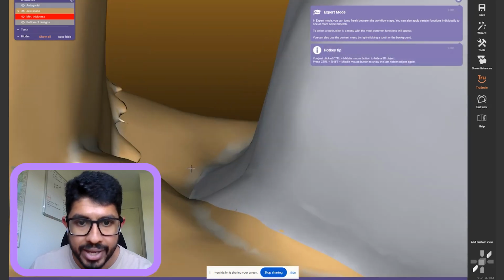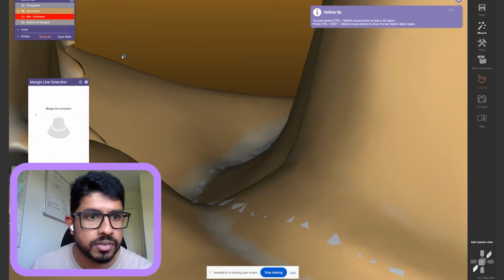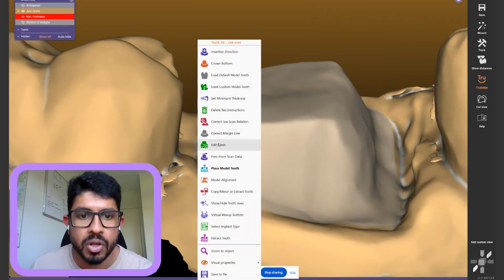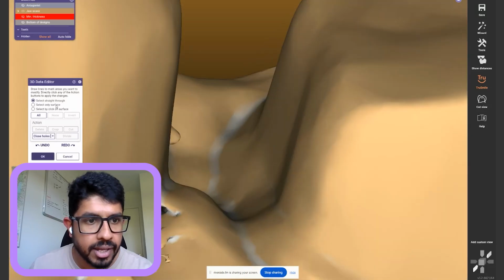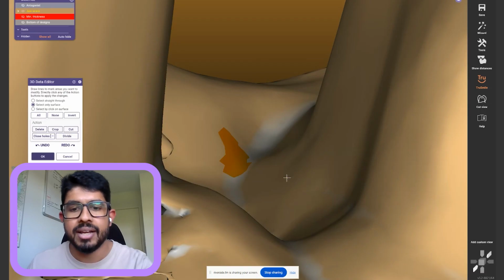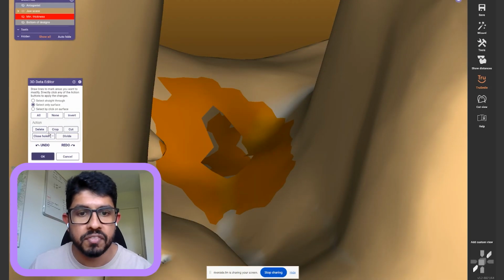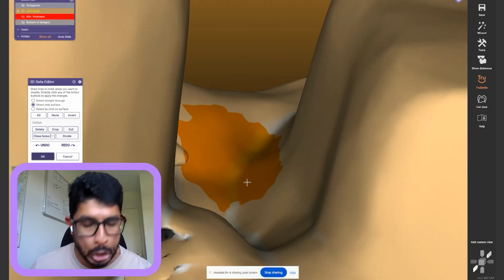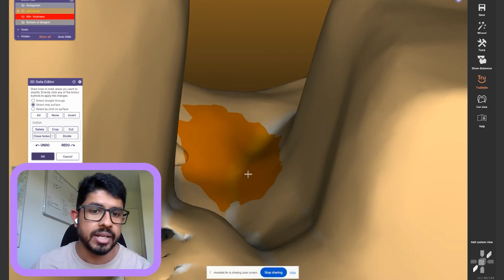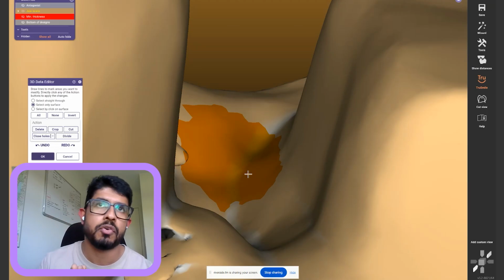You can actually go ahead. Let's say you had a little tissue tag over there. I have the option of, whoops, I clicked the wrong one there. I have the option of clicking on something called edit mesh, and I'll click on the second option here. I can simply select that little portion over there. I can delete it. I can go ahead and close holes, and it'll just kind of fill right in. Do I recommend this? Not at all. But I'm just being transparent here: people have done it, I have done it, but again, this is just a workaround.